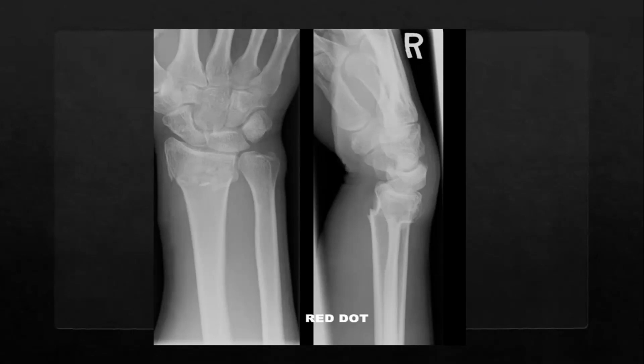So just out of interest, Ellie, did you spot the fracture immediately? Yeah, I did. And then I tried to do it in a backwards way. That's absolutely fine. I really liked how you did it. If you do spot the fracture straight away, and if you're confident, just go for it. Say there is a fracture and then start describing it.